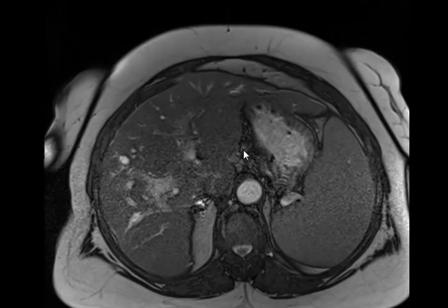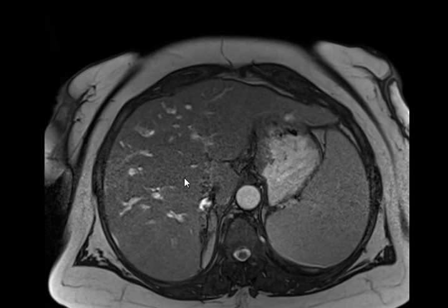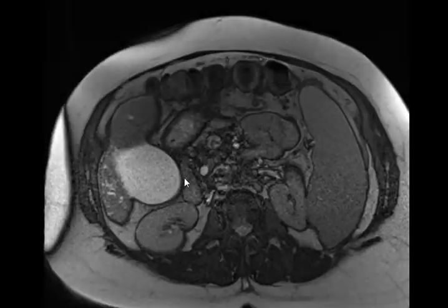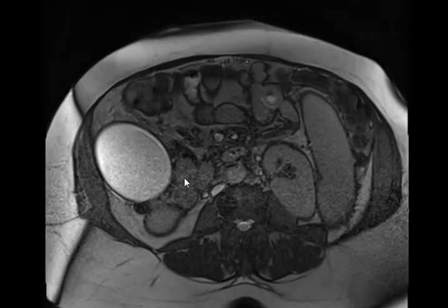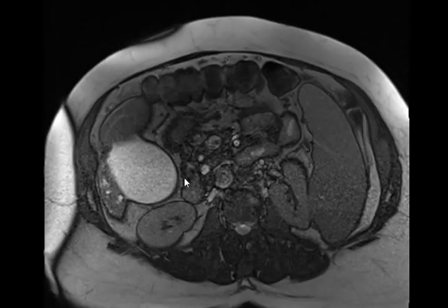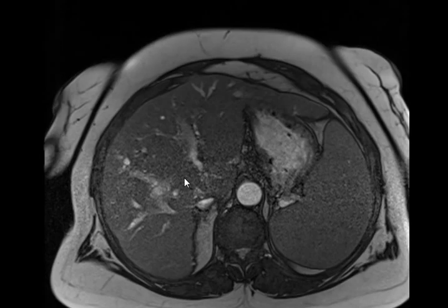This is a 58-year-old female patient. Her physician, a gastroenterologist, told me she has jaundice. She has an abnormal echo pattern on an ultrasound. I have absolutely no idea what's wrong with her. And there are no stones in the ultrasound.